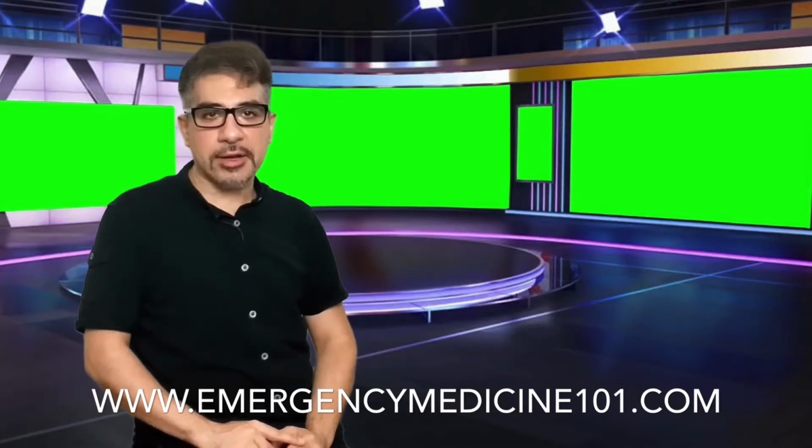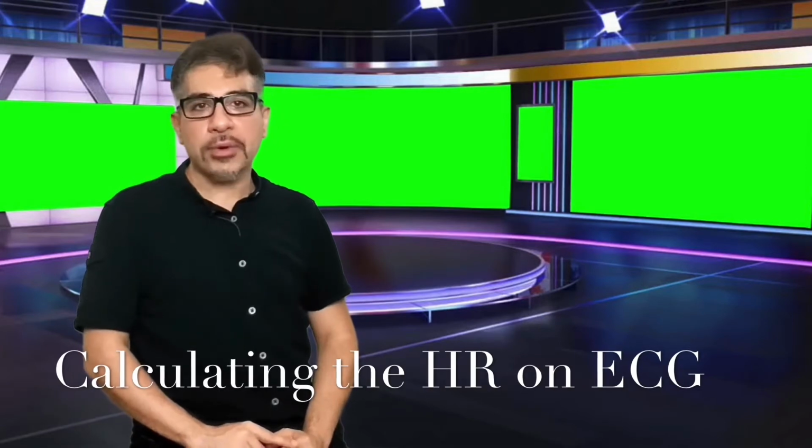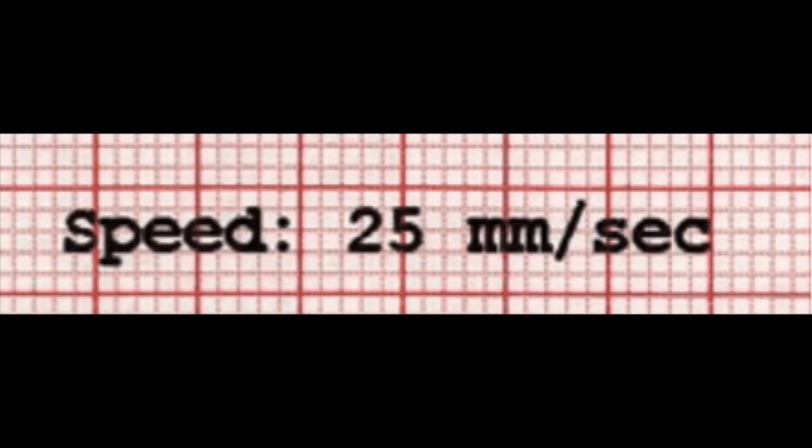I'm Dr. Yazdani. Today, I'm going to talk about two methods of calculating the heart rate on an ECG. I know it sounds silly, but it comes in handy. Standard ECGs are recorded at a paper rate of 25 millimeters per second, and that's our assumption here.